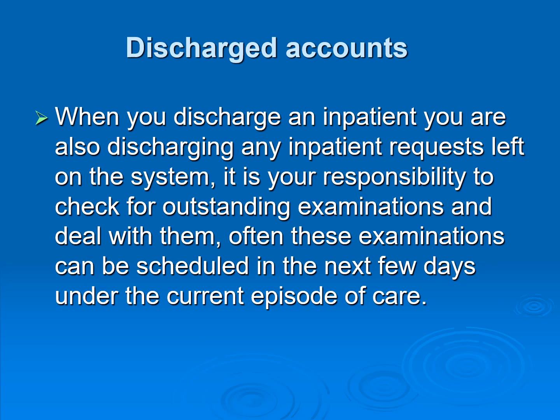When you discharge an inpatient, you are also discharging any inpatient requests left on the system. It is your responsibility to check for outstanding examinations and deal with them. Often these examinations can be scheduled in the next few days under the current episode of care.